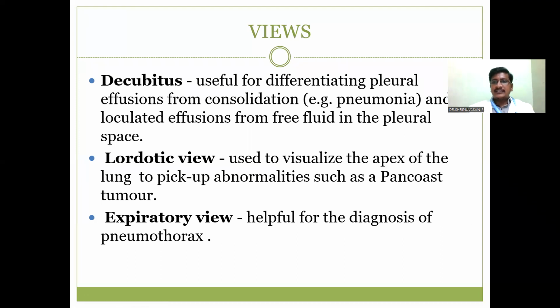So what are all the other special views? The other special views are the decubitus view. The decubitus view is useful. Decubitus means a lying down position, it may be either right lateral decubitus or left lateral decubitus. It is very useful in evaluating a lung effusion. Minimal effusion we can differentiate by doing the decubitus view.